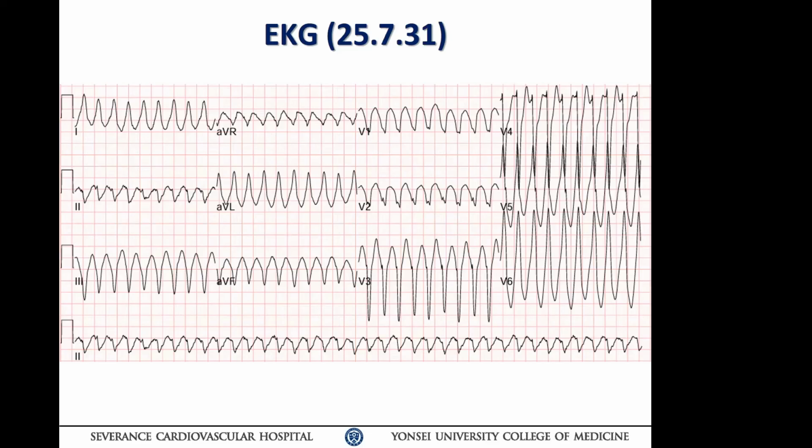And Copy mentioned V3-4-5, he looked for the anterolateral, but I think that is not a good way of localization, because usually V3-4-5 is used for apical-basal localization of the VT focus. However, it is reasonable for LV origin VT, not RV origin VT. So if it is RV origin VT, probably you should think more about the localization.